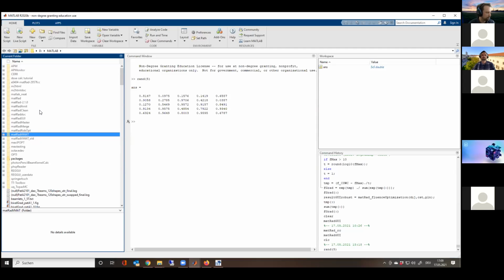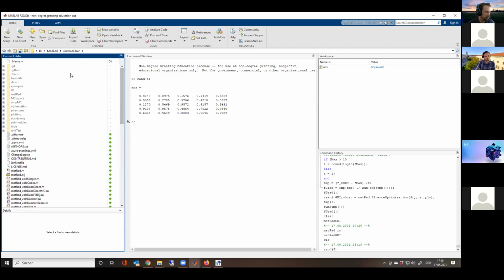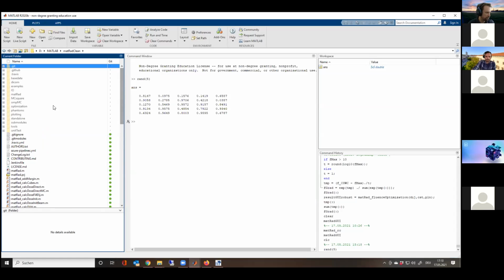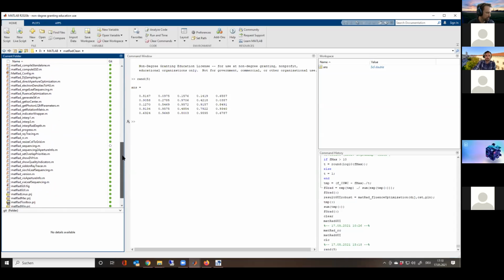And my code download that I presumably did at some point is now stored in MatRad clean. So this would be your folder that you would open here in MATLAB in the file browser, and where you unzip the code. So you should see a lot of folders. I have these Git folders because I downloaded the code. I didn't download it, I cloned it via the versioning system Git, but you can also just have the unzipped source code file that you downloaded earlier.